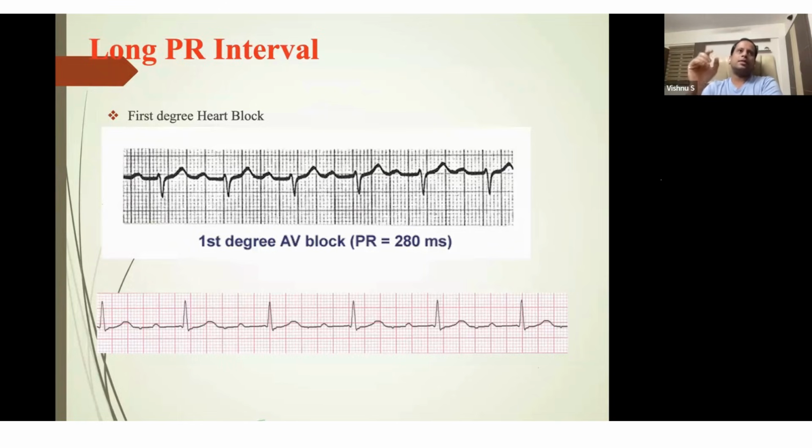So in a patient who has syncope in the clinical context, or a history of fall, and is having a first degree AV block, you have to investigate further. How to investigate? Because in between, there may be a 2:1 AV block that we are not seeing in the current ECG. So a patient with alarming symptoms like syncope or giddiness, who has a first degree AV block and is not on any drugs, warrants further evaluation in the form of a Holter study, so that it may bring out a 2:1 AV block which is coming intermittently.